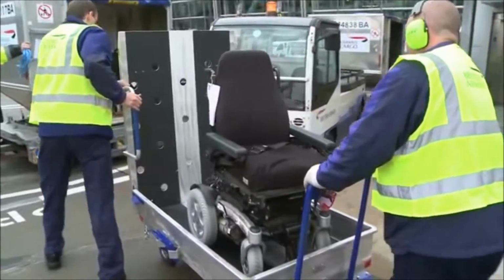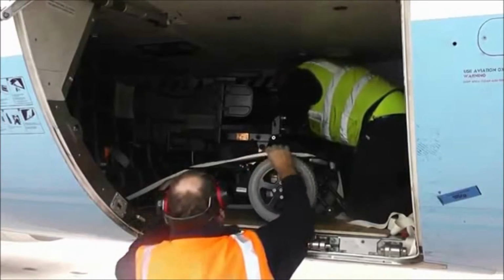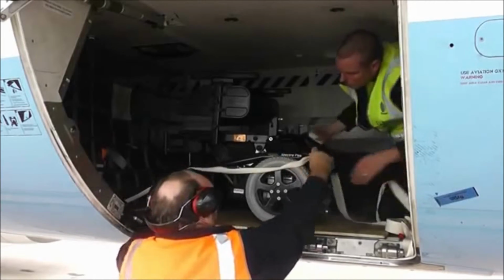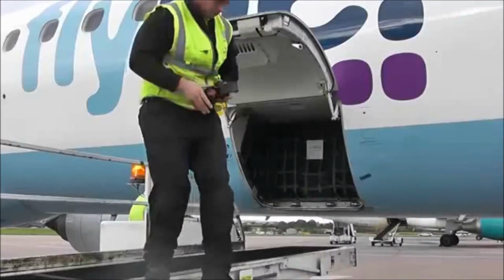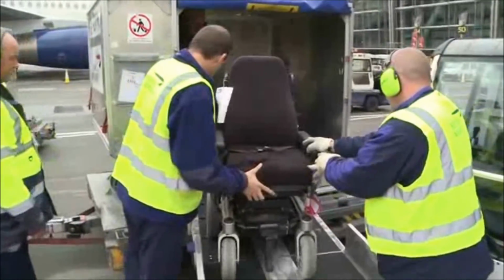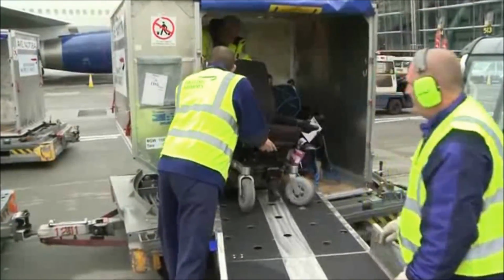Electric mobility aids must be protected from damage, and so at the load planning stage it is preferable to plan to load them into a netted compartment without other baggage or cargo. This will also assist loading teams, as they should have better access to a greater number of anchor points for restraint purposes. Similarly, for containerized operations, where possible, electric mobility aids should be assigned unit load devices without other baggage or cargo.